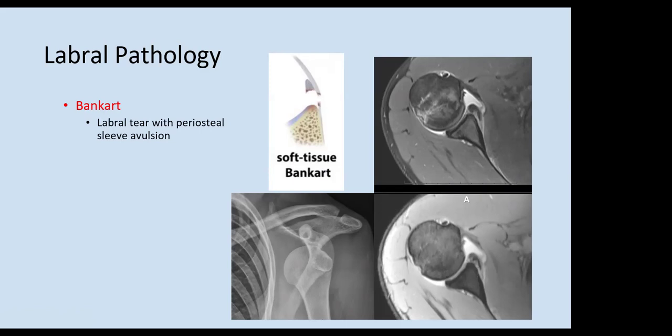So for example, you could say this is an anterior or anteroinferior tear, or you can say this tear extends from the 3 o'clock position to the 5 o'clock position if you want. Anyway, you have to give it a location where the tear is.